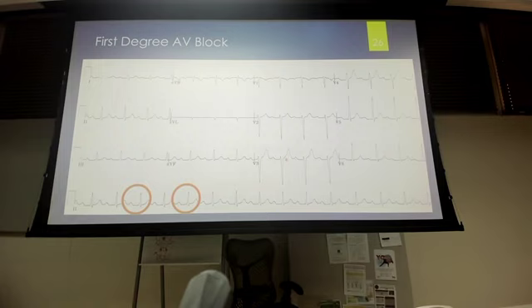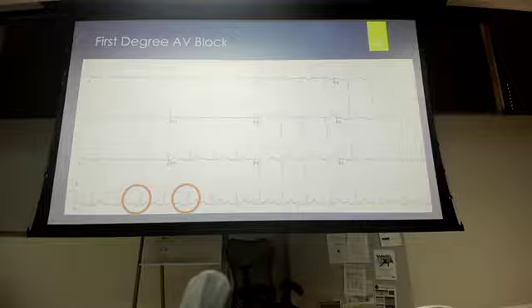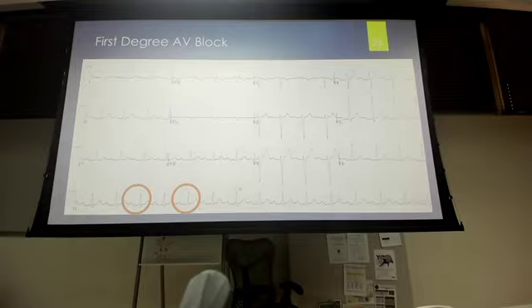This is an example on an ECG. Look down at that bottom rhythm strip. We're going to look at our PR segment, our QT segment, down at that bottom rhythm strip. This is a prolonged PR. Sometimes it is so prolonged, it'll come right off the back end of that T wave.